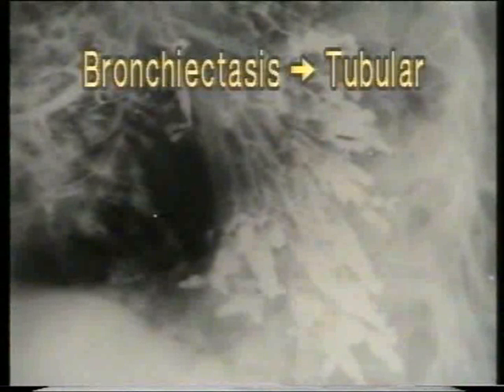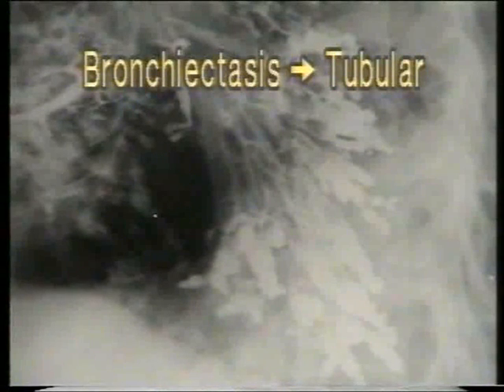However, for an absolute confirmation, it is essential to perform a bronchogram, which will also tell us the type of bronchiectasis and the extent and distribution of the disease in the lungs. In bronchiectasis, bronchi of one or more segments of the lungs are dilated and they are filled only up to 4 or 5 divisions as the distal bronchioles are occluded. Here we see a tubular type of bronchiectasis where the bronchi are uniformly dilated.